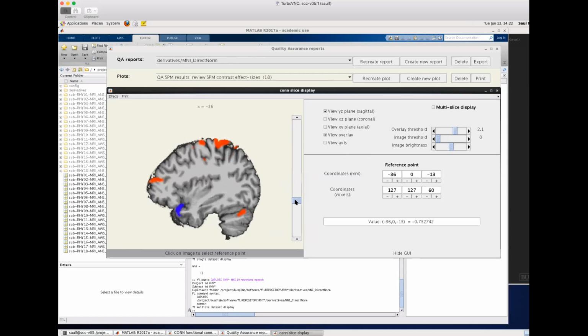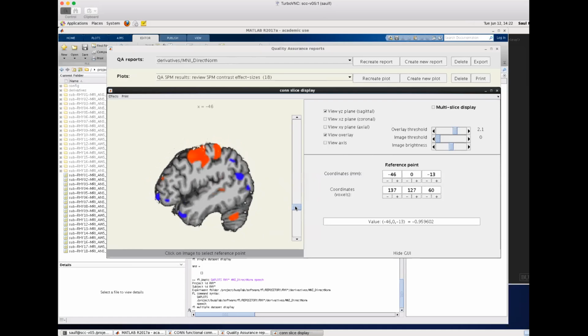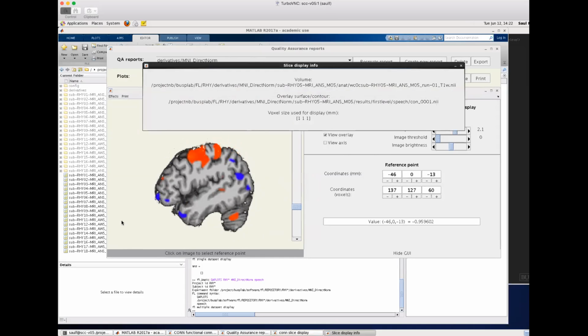I don't recall what it was. What's the typical threshold on activation here? As far as I could tell, it ranged between about 2 and 3, but I think by default it's trying to show you only the top 5% or 10% or so. I don't recall the default threshold value, but it's set to a percentile level.